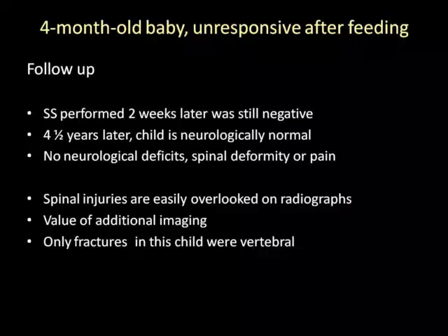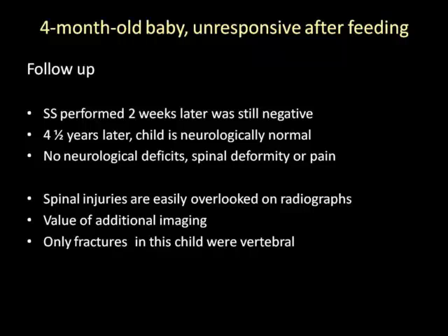So this case highlights the fact that spinal injuries are easily overlooked on radiographs, and it shows you the value of additional imaging. In addition, in this child, the only fractures that were identified were spinal, and were very helpful in establishing the correct diagnosis for this child.